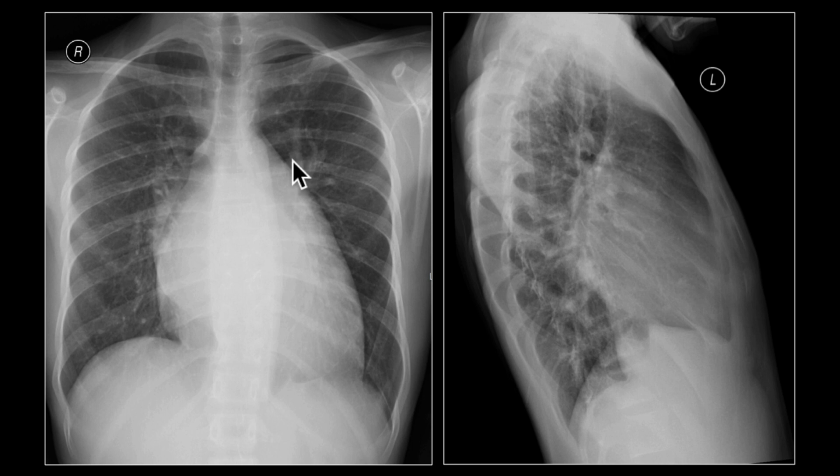In a normal case, when the patient is standing, and due to the effect of gravity, the vessels in the lower lungs should be larger than those in the upper lungs. That should be the normal case. The easiest area to compare is the left upper with the right lower lung regions. If you do that here, you'll notice that the opposite is happening. The vessels in the upper lungs are obviously way larger than what you see in the lower lungs. Look how thready the vessels are here.